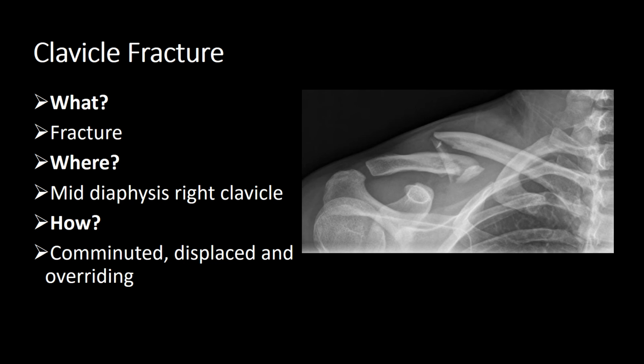So, what is it? It's a fracture. Where is it? It's the mid-diaphysis of the right clavicle. How? Comminuted, displaced and overriding.